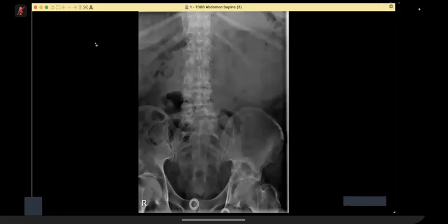I can't see any lesions in the vertebra. Also, the visualized ribs are seen normal. I can't see a definite lesion. The lesion is also displacing the bowel loops to the contralateral, right side. In my routine practice, I'll proceed to a CT abdomen to check.